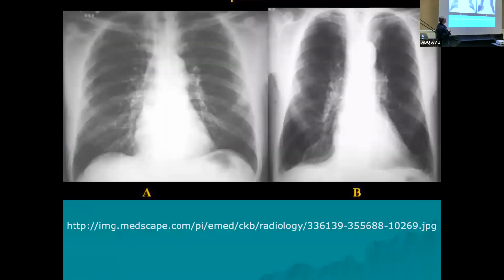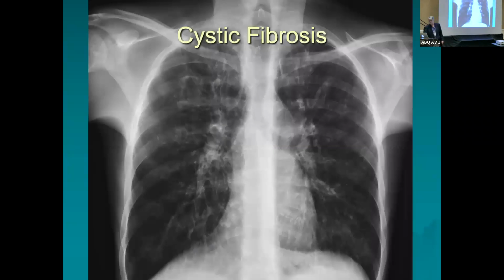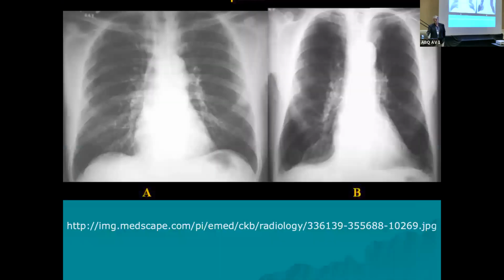Whoop, back up. This is cystic fibrosis, and you can see through the lungs right through here, he's got a lot of scarring present in this parahilar region, but more extending up into the upper lobes. You can see a little scarring right here. And again, she took very good care of him, able to advance. On my pictures up here, you can see a little bit more scarring right in through here. So you'll have scarring throughout the lung fields on this one.